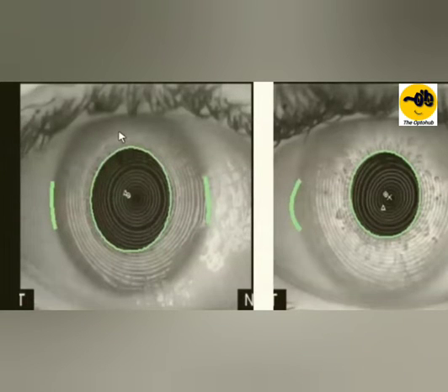So you need to remember two things. Whenever you see such a pattern, that means the cornea is probably normal and regular. When you see that these rings are close to each other, that means that region on the cornea is steep in nature. And if you see that the rings are far from each other, that means that the cornea is flat in nature. So the ring images itself will give you a little bit of an idea about what kind of cornea you are dealing with.